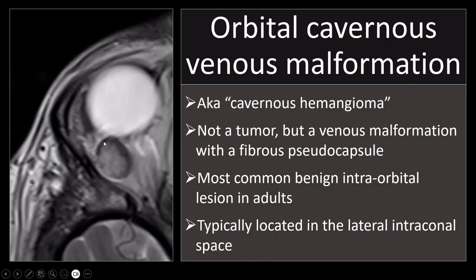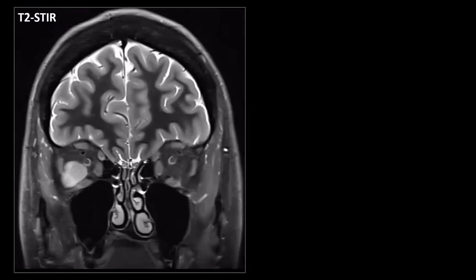So you can often see on T2 weighted images a chemical shift artifact because this is mostly watery. It consists of blood, a watery fluid, and this is fat, intraorbital fat. So we get a chemical shift artifact because it's a border zone between a fatty lesion, I mean fat, and a watery lesion. So that is something you often see, and also the inhomogeneous contrast enhancement.